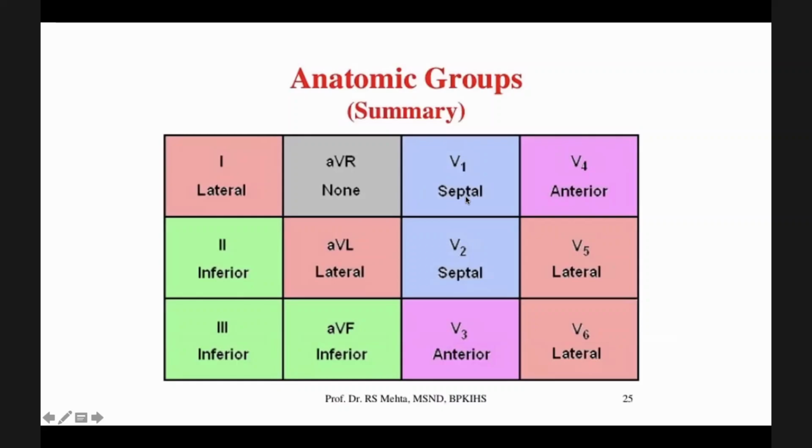And leads V1, V2, you call septal leads. And V3, V4 are anterior leads. Okay, so depending on these, we diagnose and name the MIs by looking at the ECG.